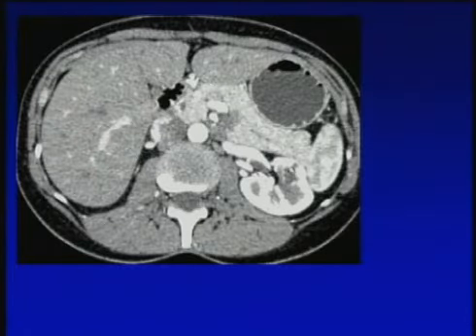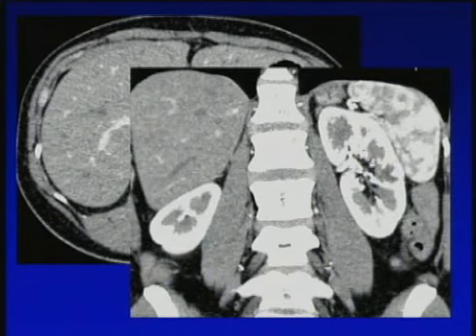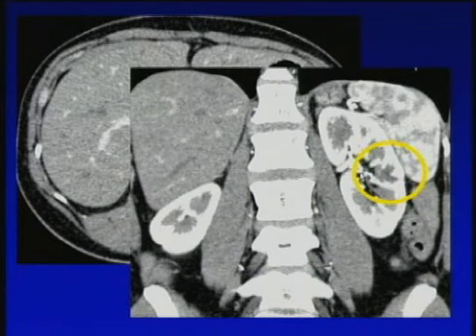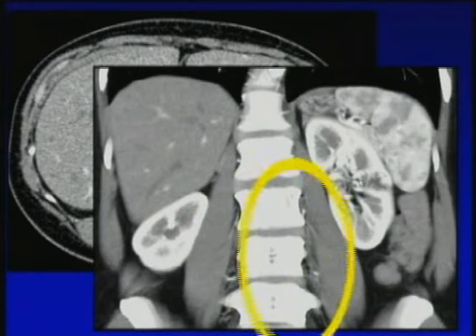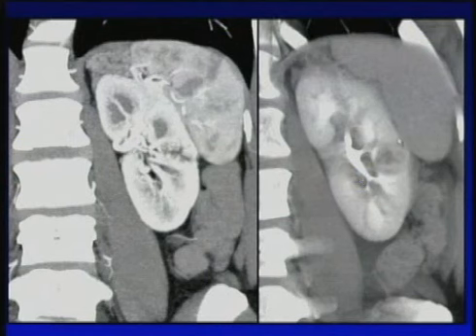And here's one more example where there's a cystic lesion here with enhancement. Again, it's probably very subtle. Again, here it is in coronal display. Even there it is kind of subtle, particularly when you take that image and you go from there to there. Here it is again, right there. But sure, a lot easier to look at on excretory phase imaging.